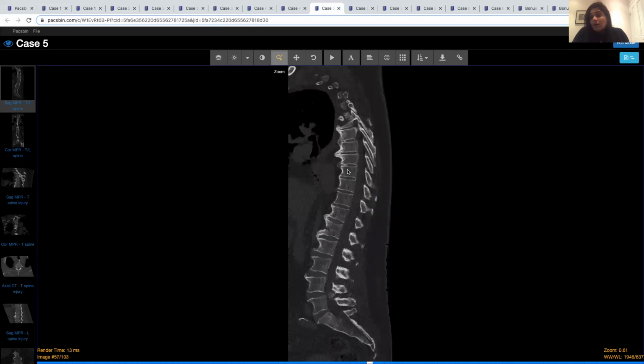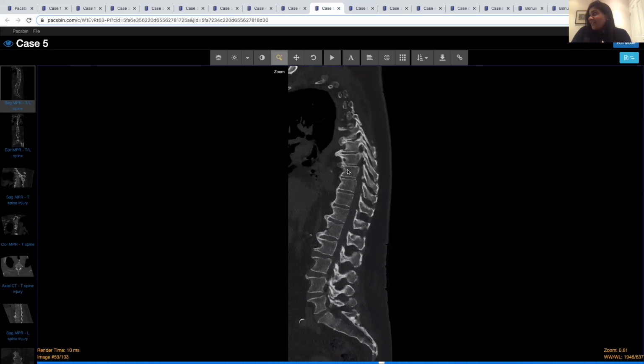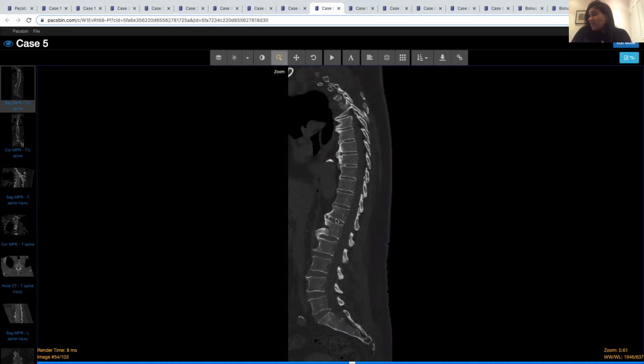So immediately you might be recognizing that this is a patient who has DISH, so diffuse idiopathic skeletal hyperostosis. And that is indeed what this patient has, and they have long fused segments, some segments which aren't fused and some segments which are. Now, this is important to recognize, because patients who have fused spines, whether it's as a result of DISH or ankylosing spondylitis, often get fractures with trivial trauma.